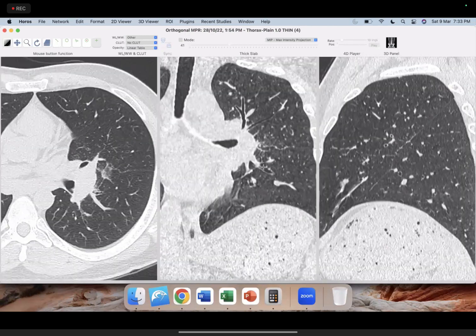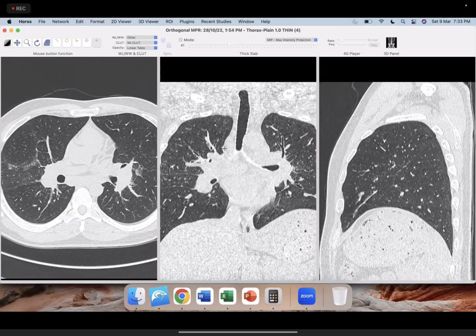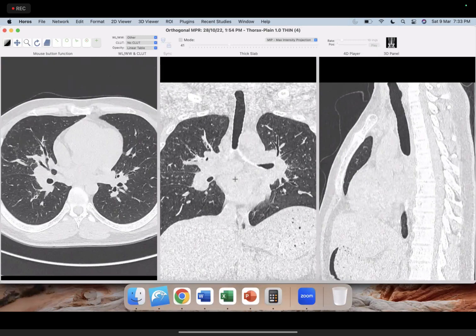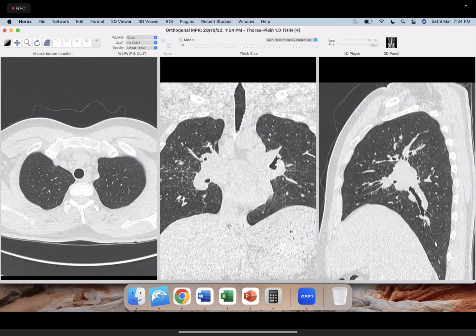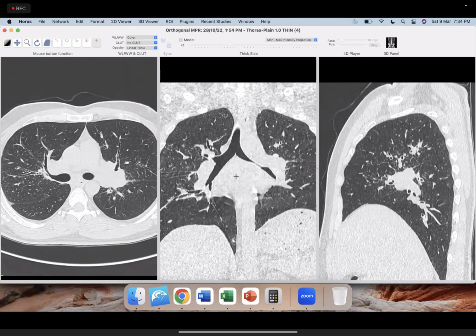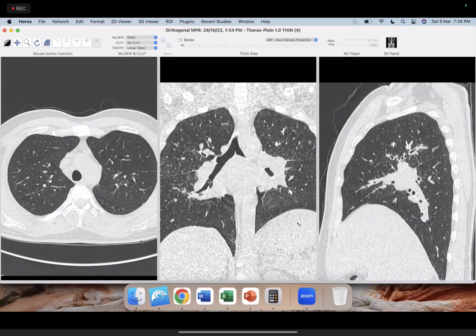Plus some subpleural nodules. So what is this distribution, as against the previous HP example where we saw bronchocentric? This is showing perivascular, subpleural and fissural, where the lymphatics run in the secondary pulmonary lobule. So this is your perilymphatic distribution. And if you can even appreciate, the predominant distribution is also perihilar rather than the upper apical or basal predominance. So that's typical for sarcoidosis. Any perilymphatic nodule disease, the typical example is sarcoidosis.